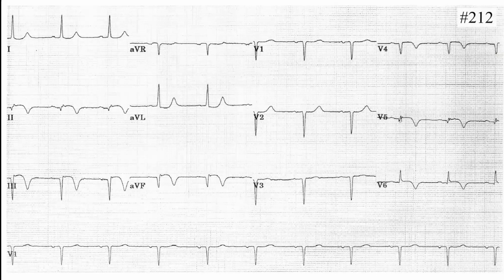Lethal. Come on. Oh, yes, Lethal. Nordkin, Lethal. Are you here? Yes, I'm here. Okay, good. Now let's solve this ECG.